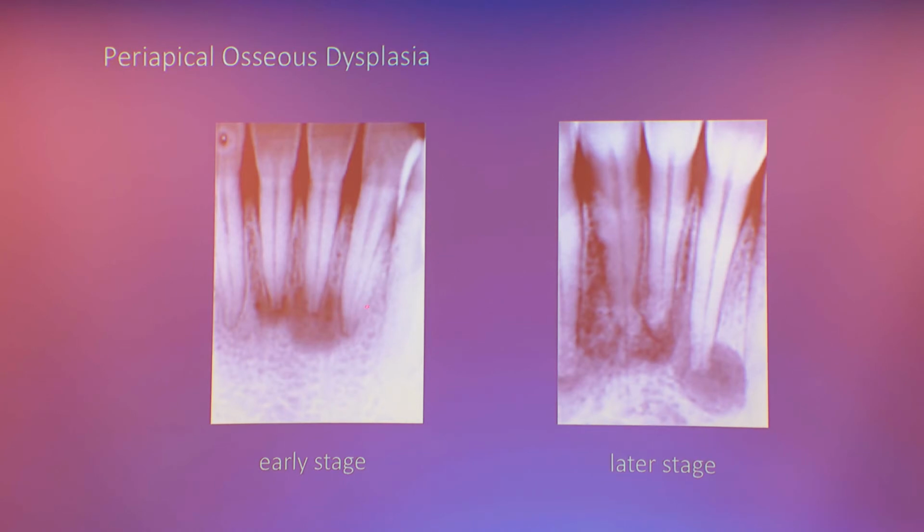There are a couple clues radiographically. The PDLs are intact around all of these teeth. This one didn't reproduce very well, but the PDLs are intact. If this were a radicular cyst, the PDL space should be widened. Also clinically, these teeth respond normally. They remain vital. Okay, later stage, what started out as a lucency becomes more mixed in density.